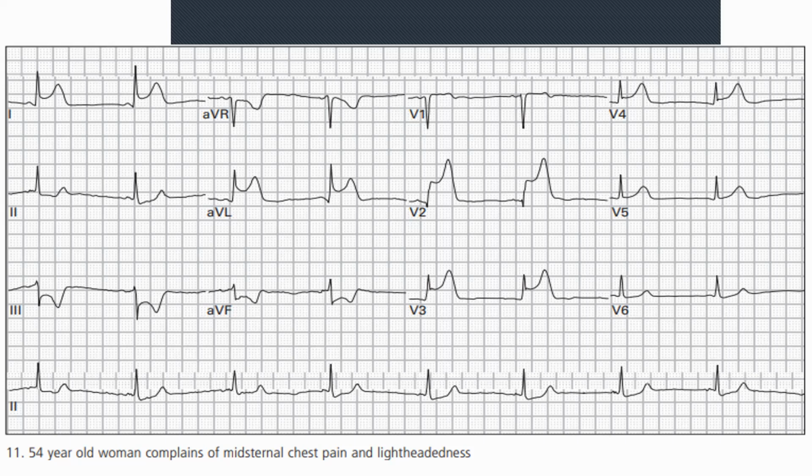Anteroseptal, right, is a common term used. So you can say I've got anteroseptal plus high lateral extension. All right. So how much of the heart are you looking at in terms of those three zones? Is it a small piece of the heart, big piece of the heart? Big piece of the heart. It's a massive piece of the heart as well. Almost the entire left side is completely involved in this process.